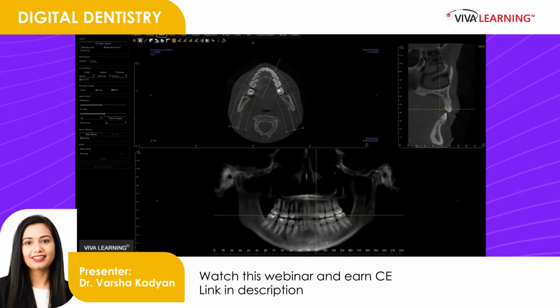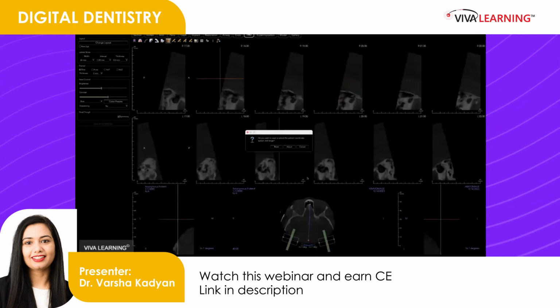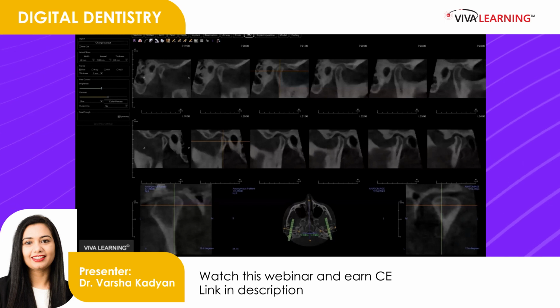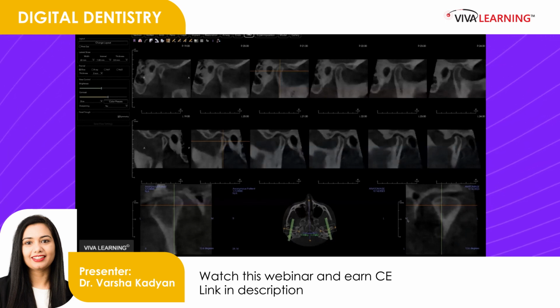And then there is another function where you can review your TMJ area. So this is the cross-section of the TMJs, right and left. As you can see, this is the right side, this is the left side. This is the medial surface of the condyle, and this is the lateral surface of the condyle.